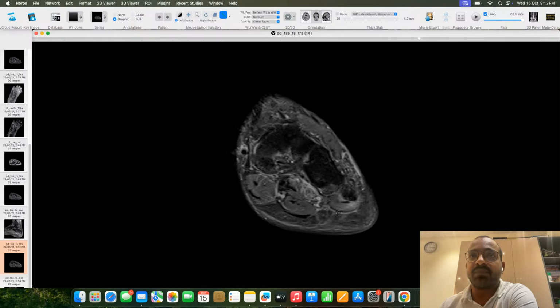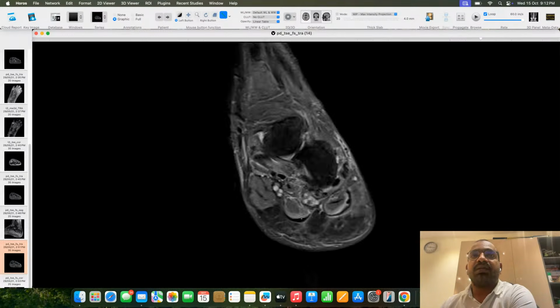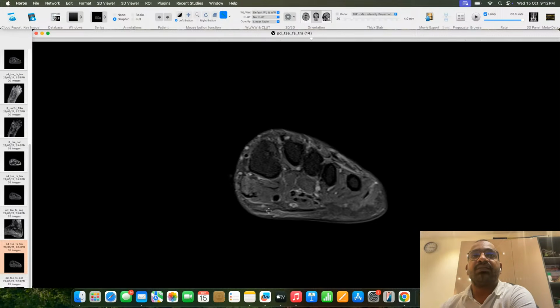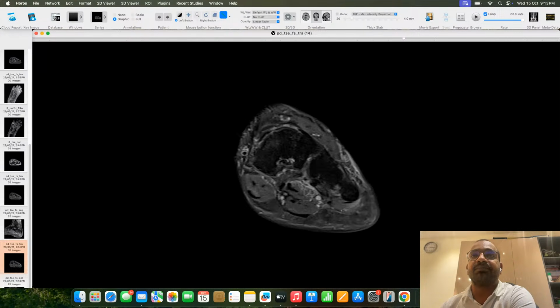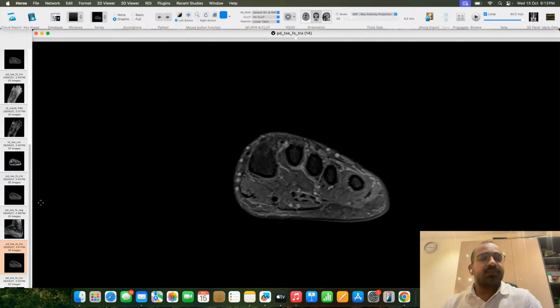of the plantar fascia. You can see this. This is the lateral. This is the intermediate one, and a few fibers go and they form the medial. This is the medial, intermediate, and this is the lateral band of the plantar fascia. That's it. So this is a straight case. Just wanted to start with this.